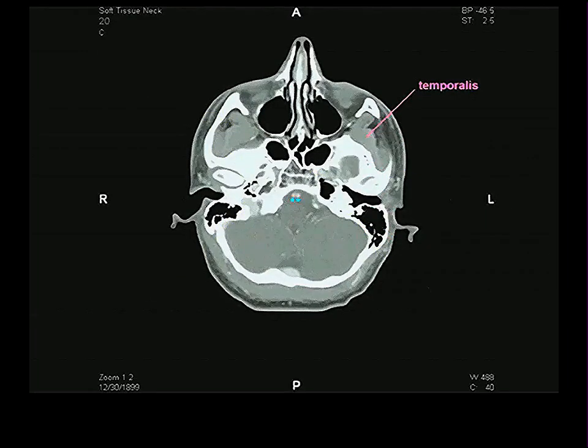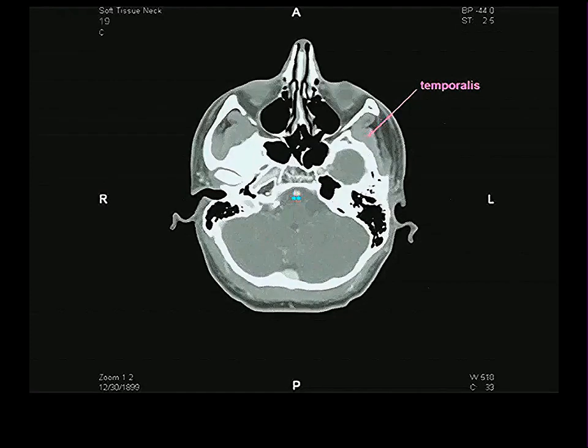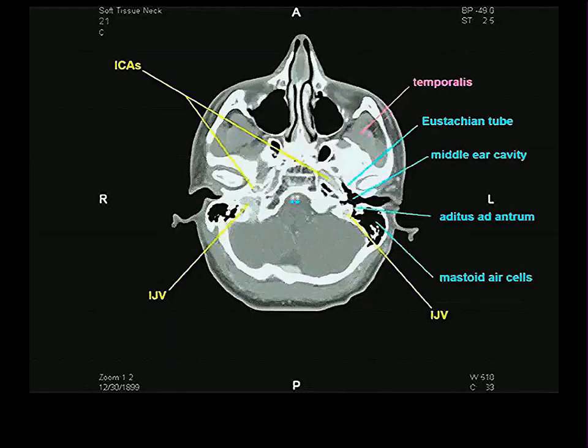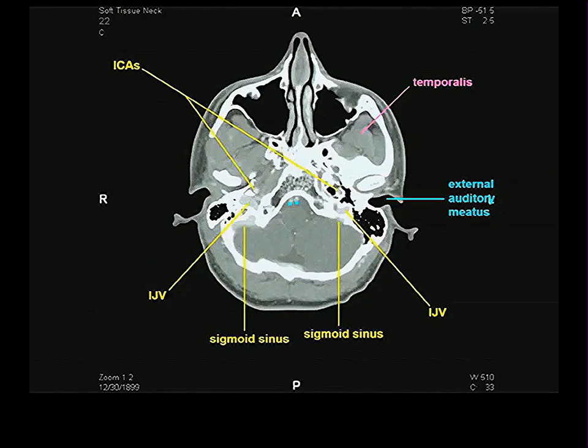And we continue to go up. Our vertebrals are getting very close together. Here's the carotid on the right side, passing through the carotid canal in the petrous temporal. Did I miss the sigmoid sinus? Here it is. I forgot to mention it. Here's the sigmoid sinus, which will connect up to the internal jugular vein. That'll be true on both the right and left sides.